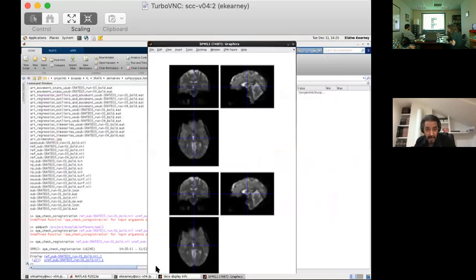So if the direction, let me see, that doesn't look that good. It doesn't look thoroughly good to me. That correction, in fact, seems to be doing the opposite. Looks terribly similar. Yeah. That I don't like.